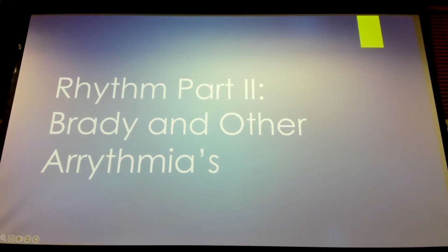I put some EKGs up here for you guys. Some of the stuff we reviewed already, some of it we haven't. But I encourage you to read these, and I've gotten the diagnosis, or at least what the machine reads out. If there are any changes, someone will have made a little note to the side. So read these and then flip it over and see if you're familiar with them.